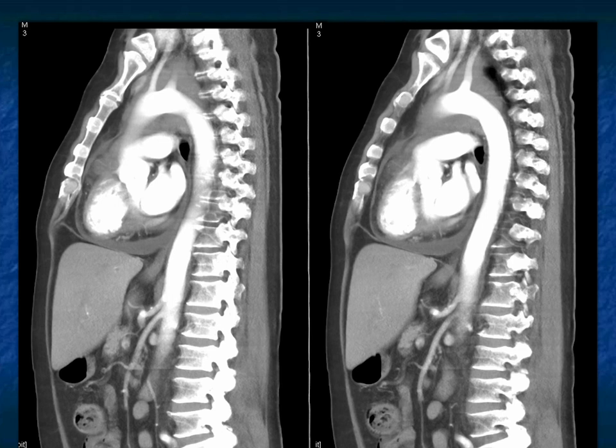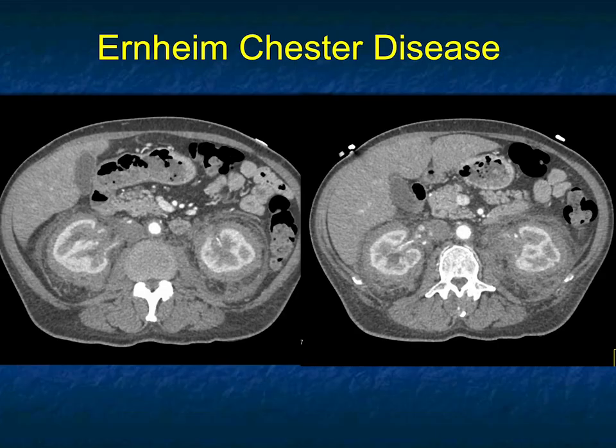But then if I only had more images in the abdomen, I would see infiltration of the kidneys. When I look at this case of infiltration of the kidneys, if I only look at the kidneys alone, I could say lymphoma. I could say extramedullary hematopoiesis as possibilities. Infiltration of both pararenal spaces and perirenal spaces, again, it's something diffuse. But then there's also the encasement of the aorta, retroperitoneal fibrosis, but it's a bit too much in terms of the kidneys. The kidneys would be retracted medially with retroperitoneal fibrosis.